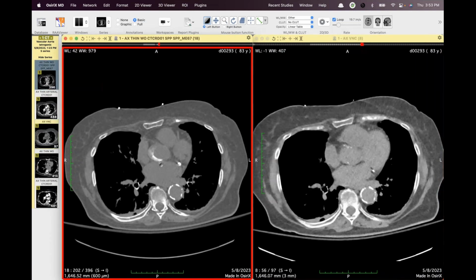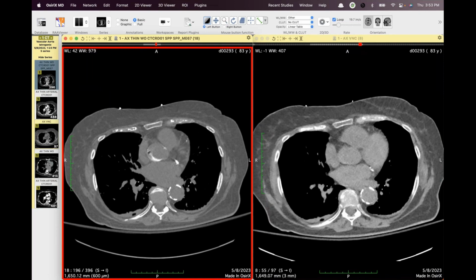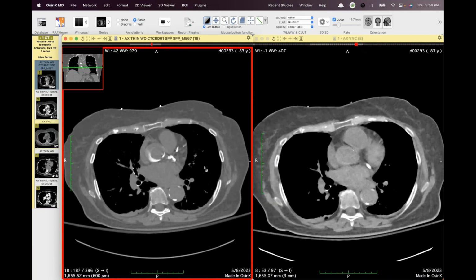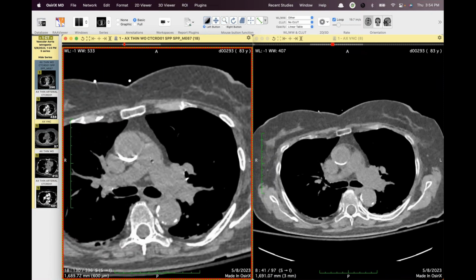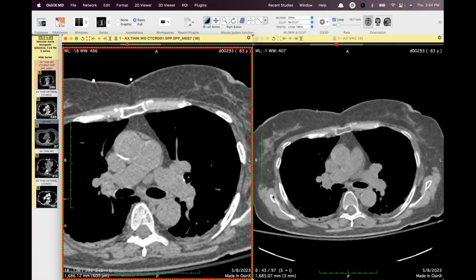And I know we've shown cases of this before, with cath contrast being injected into the pericardium or into the aortic wall. I also thought this was kind of interesting. Actually, it's right there, Howard. You can see there's a little bit of shared sheath contrast. It's getting into that shared adventitial sheath with the pulmonary artery. A very tiny speck right there.